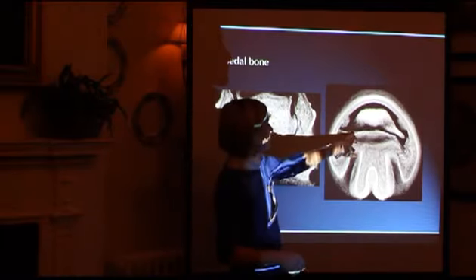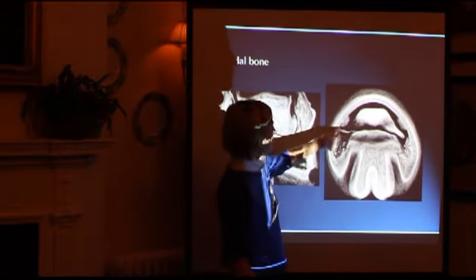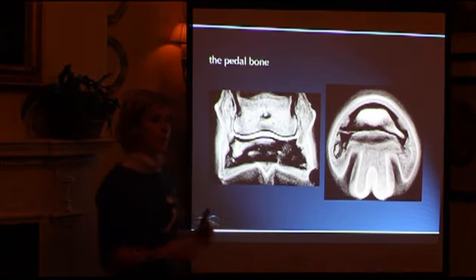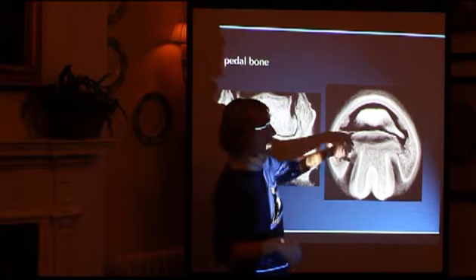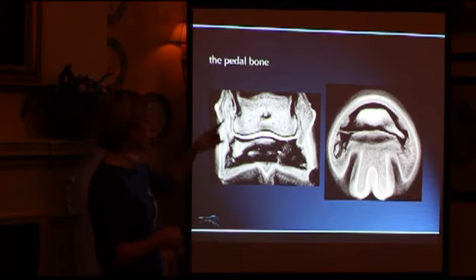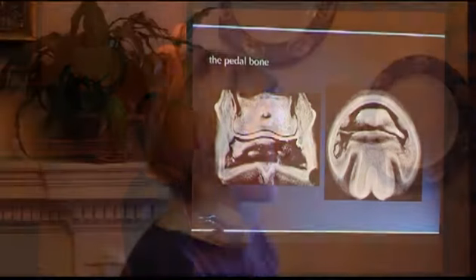And here you can see how close this wing fracture is to the caudal aspect of the collateral ligament here. So this is the collateral fossa of the pedal bone. This is the fracture running through here. And what we do when we get wing fractures, which should be very benign, is cause instability with all the ligamentous structures of that area of the foot, not just the collateral ligament. So when these horses sometimes don't come up sound, and perhaps in cases particularly where the fracture wasn't picked up very quickly, so they weren't box rested, they've stressed the ligamentous structures on that side of the foot. So you're looking at desmitis or desmopathy as a cause of lameness in those structures rather than necessarily the pedal bone itself. So it can be very useful just to say, well, why is this case not coming along quite as well as I thought it would?